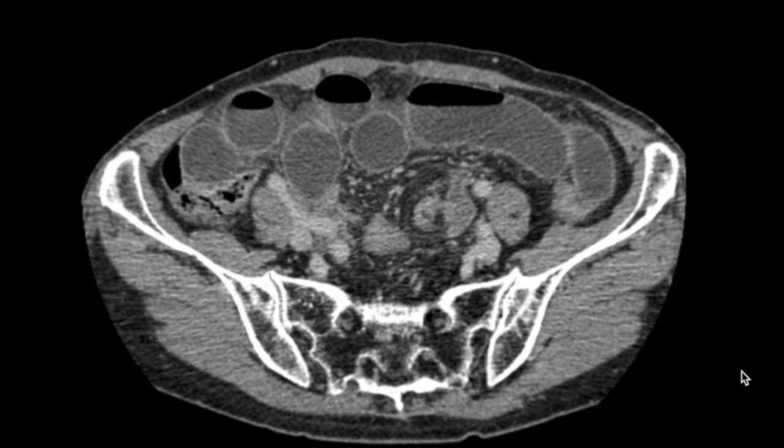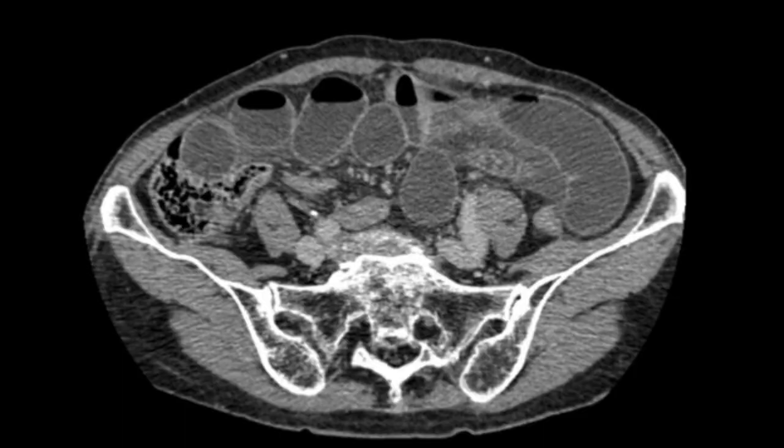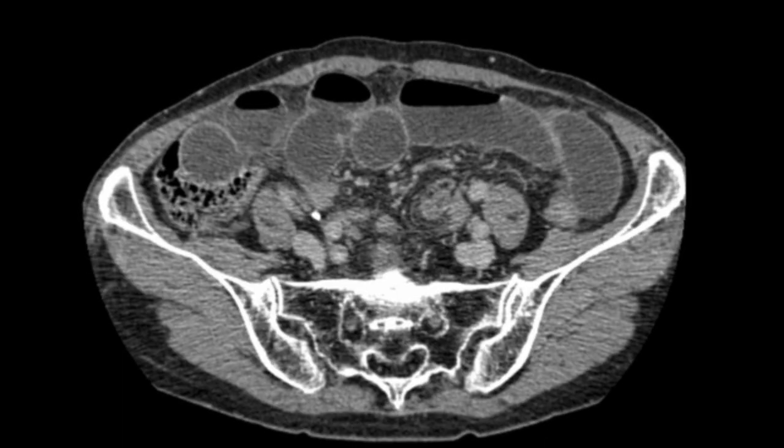Since this is adhesive ileus, there's little risk of the small intestine becoming ischemic and necrotic. Although the passage disturbance requires treatment, surgery is often unnecessary. With intravenous nourishment and decompression of the intestinal contents using an ileus tube, the obstruction will gradually resolve and heal. How is this? This is how we read images of ileus and intestinal obstruction. In this case, the findings were minimal because it was simple obstruction due to adhesions. But in strangulated obstruction, there are many different signs to discuss. We'll go through those one by one when we encounter a strangulated obstruction case.